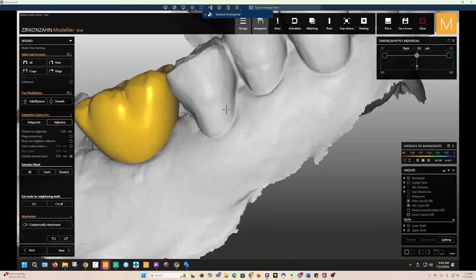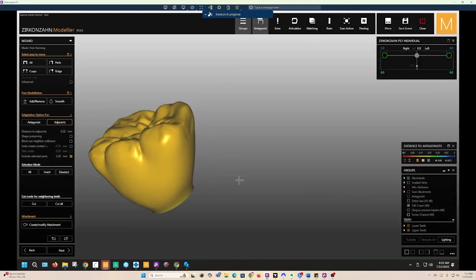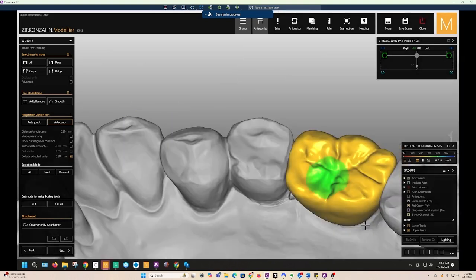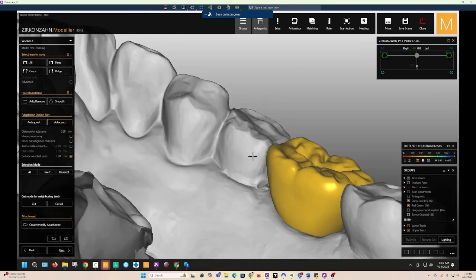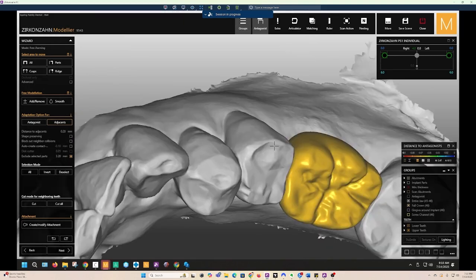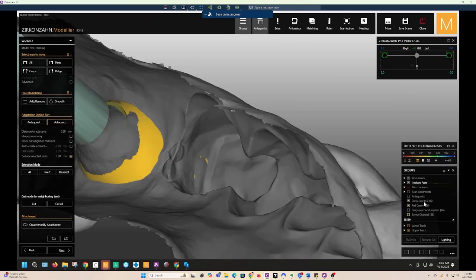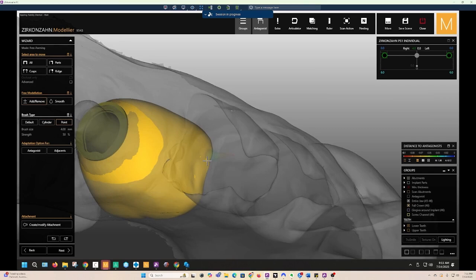See how, just going to leave it as is. Here, I didn't like how it was coming up, so I'm going to just remove those two sections. So yeah, that's too strong.